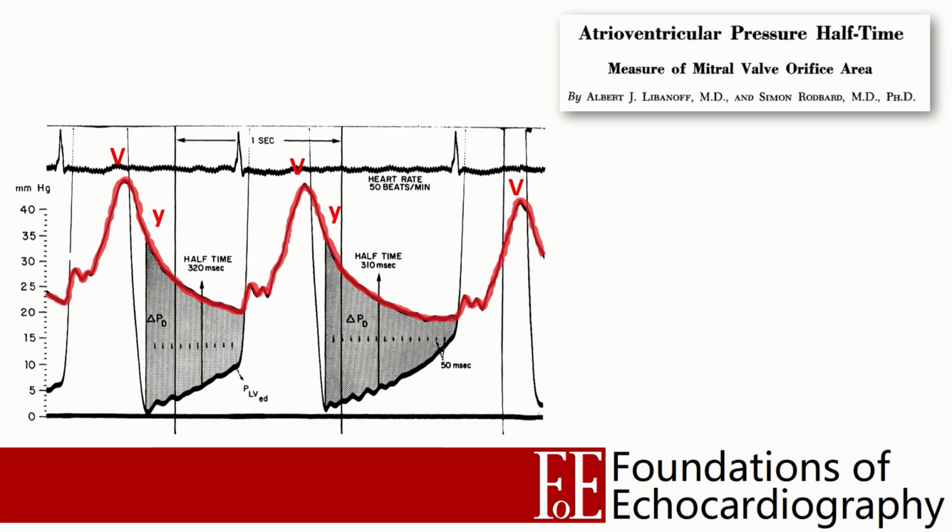Another way to describe the shape of this continuous wave Doppler envelope is the pressure half-time. In invasive hemodynamic studies, it was found that there was a good correlation between the clinical severity of mitral stenosis and how long it takes for the LA and LV pressure to equalize during diastole.